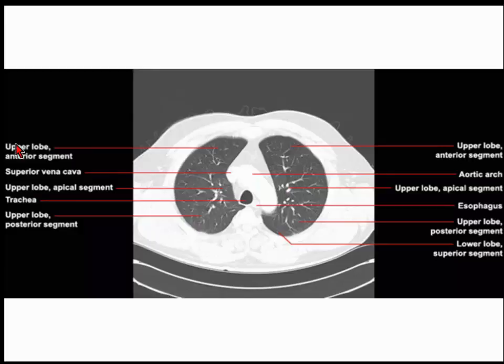So you've got the upper lobe, which is anterior. Sometimes you can see the fissure, which may be a line going through. I'm not sure whether this is, but you follow up and down a line, then you can identify. So this is the upper lobe, and then probably that line, that's the fissure. So that defines the upper and lower lobe segments.